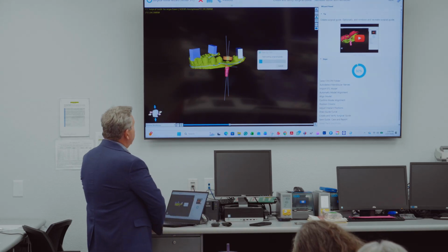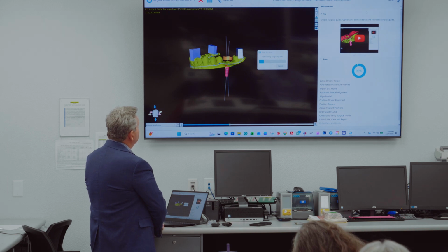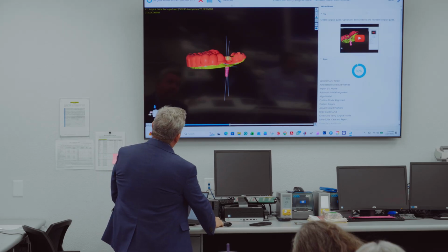Okay, so it's going to fabricate the guide for you. Okay, there we go. We're done.